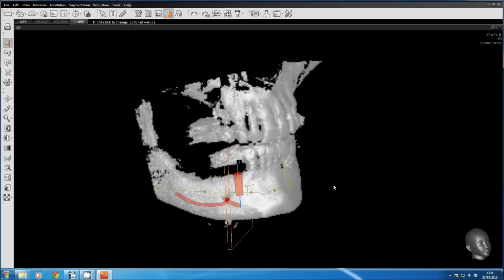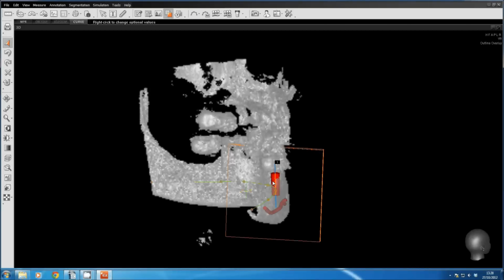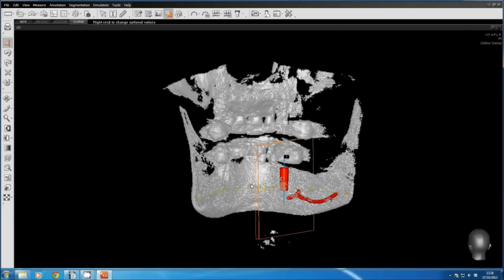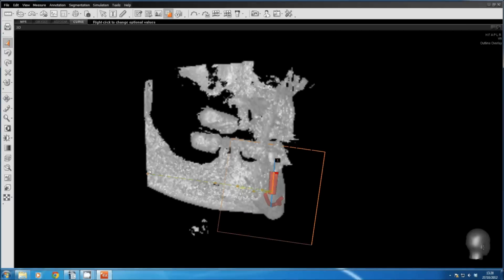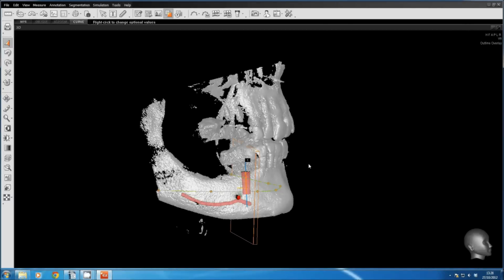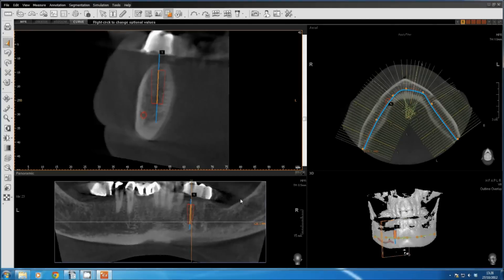But we've covered off what we need to cover off, and if we look all the way around, we can see that if we place a 12mm implant in that situation, we are not going to hit any important structures. So we can feel reasonably comfortable looking at that. I don't think I'd have gone to a 14. That's obviously personal preference. Be a bit close for my liking. So that just about covers the lower mandible in this first and basic tutorial.